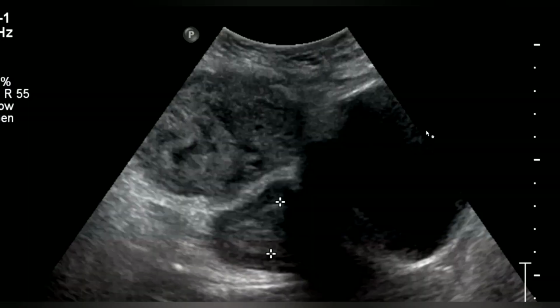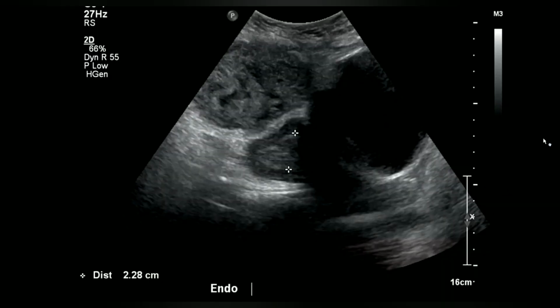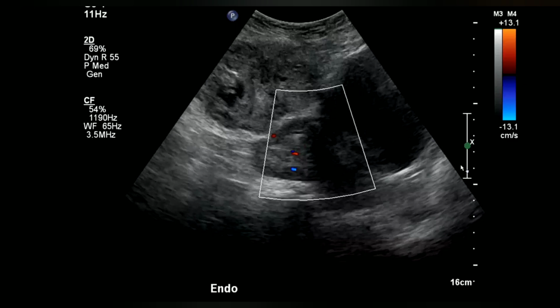On the grayscale ultrasound image of a postpartum patient, the uterus appears bulky, status postpartum, and an irregular echogenic area is noted in the lower uterine segment. And next, I would like to see the Doppler image. Okay. Are you talking about this? Yes, ma'am. Okay, this is within the fundus, like in the endometrium. Even if she's postpartum, it's bulky, it's more than expected, right?